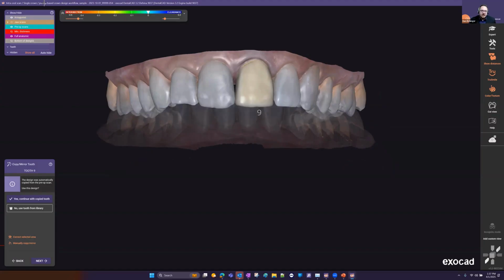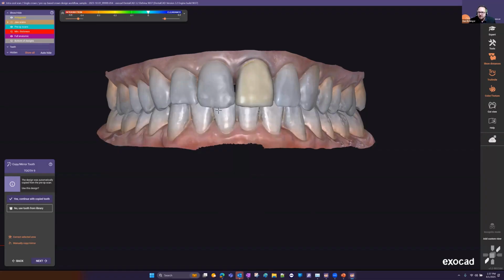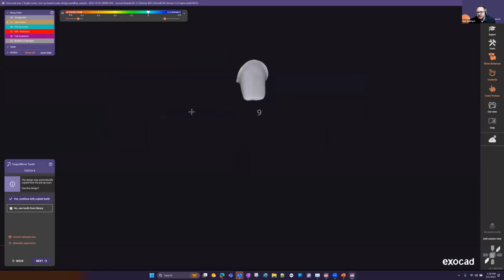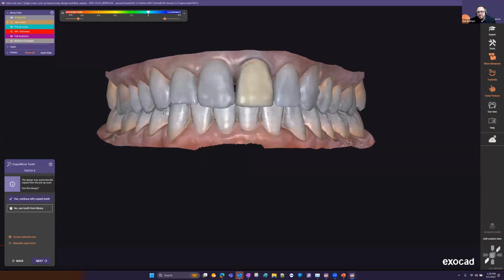Now, this is great, but another hotkey that I love to utilize is you hold the shift button on your keyboard and your mouse wheel button, if you click it in like a button, that's going to toggle your transparency to all your objects. Now, sometimes you need to turn items off. So that would be control and mouse wheel button. And then if you want to turn items back on, control, shift, and mouse wheel button. And it'll toggle those items back in the order you turned them off.